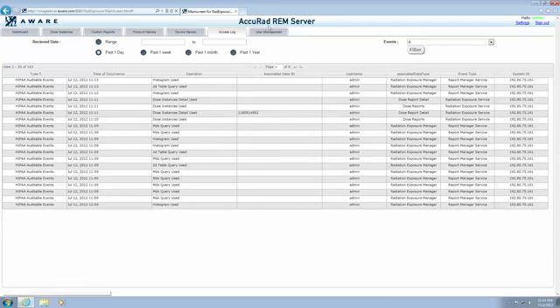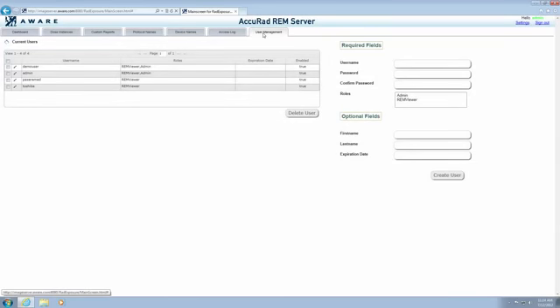We have integrated user management, which means all of the tabs are access controlled by privileges and they're customizable per site, so different users can have a different set of tabs. We can also delegate all of the user authentication to LDAP servers or Active Directory servers, so that our system doesn't need to maintain that state.